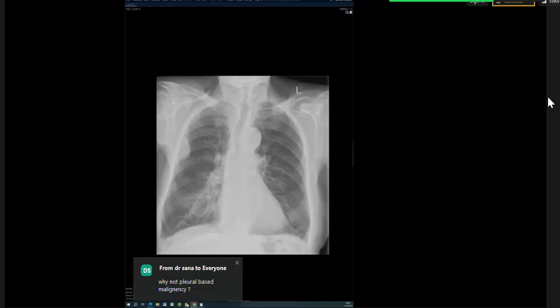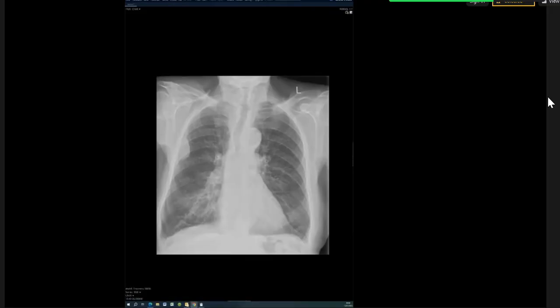Post-lung fibrosis, why not TB? It can be TB. In TB, when you get fibrosis like that, the lung has cavitation. The lung has a lot more asymmetrical scarring. You get bronchiectasis, you get scarring and cavitation. So I can show you a case next time for TB to put it side by side so you can appreciate it. But yes, purely on X-ray, you can talk about TB. But when it comes to that CT, you should think of sarcoidosis only.